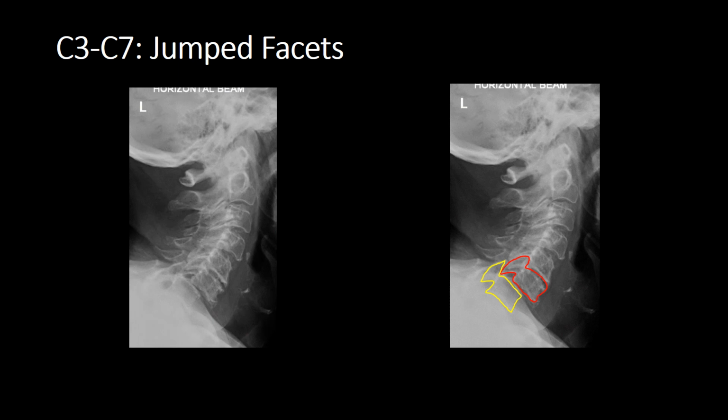So A is adequate. Yeah, we got the base of the skull. 1, 2, 3, 4, 5, 6, 7. So we can't see T1. In clinical practice, we would want to do a swimmer's view.